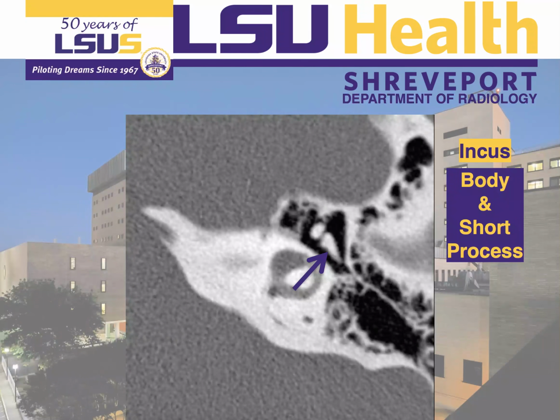Okay, let's make a quick review of what we learned so far. This is the ice cream cone. The ice cream itself is the head of the malleus. This is the incudomalleolar joint, the body of the incus, the short process of the incus, the Prussak space. This is the lateral semicircular canal ending in the vestibule. This is part of the posterior semicircular canal. The middle ear connects to the mastoid cells through the aditus ad antrum, which is not so good to see on this slice.